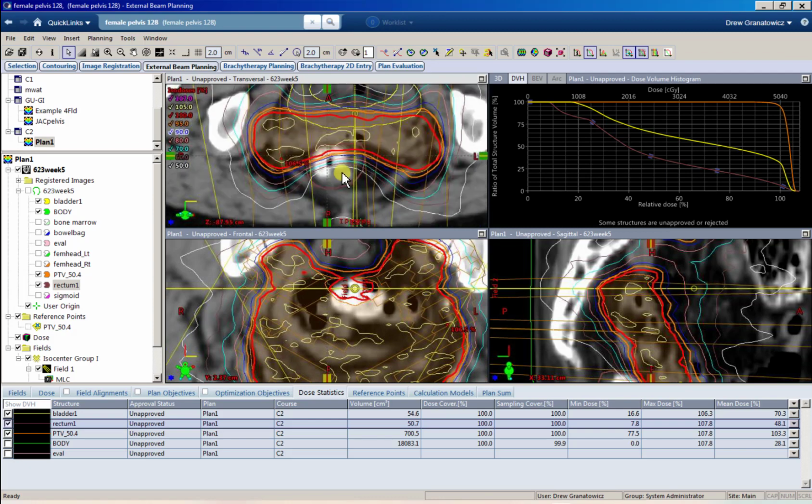A good rule of thumb when you're looking at a dose distribution is for conventionally fractionated plans, meaning you can't have a big hotspot and the volumes are usually bigger and oddly shaped, you can generally get fall off between 5 and 10% of your dose every millimeter.